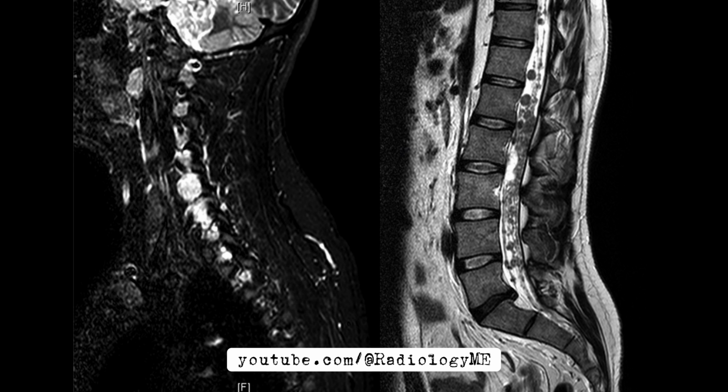Now, putting together the clinical picture and radiological findings, the constellation of multiple intracranial and spinal lesions, including bilateral vestibular schwannomas, intraventricular meningiomas, and spinal neurofibromas or schwannomas, points us toward a diagnosis of neurofibromatosis type 2, NF2. This is a genetic disorder characterized by the development of multiple tumors, especially schwannomas, meningiomas, and ependymomas.